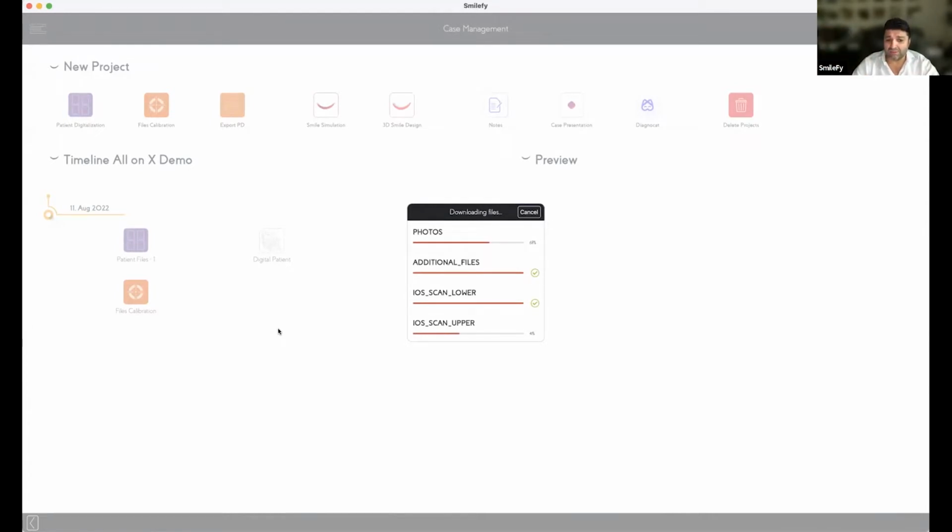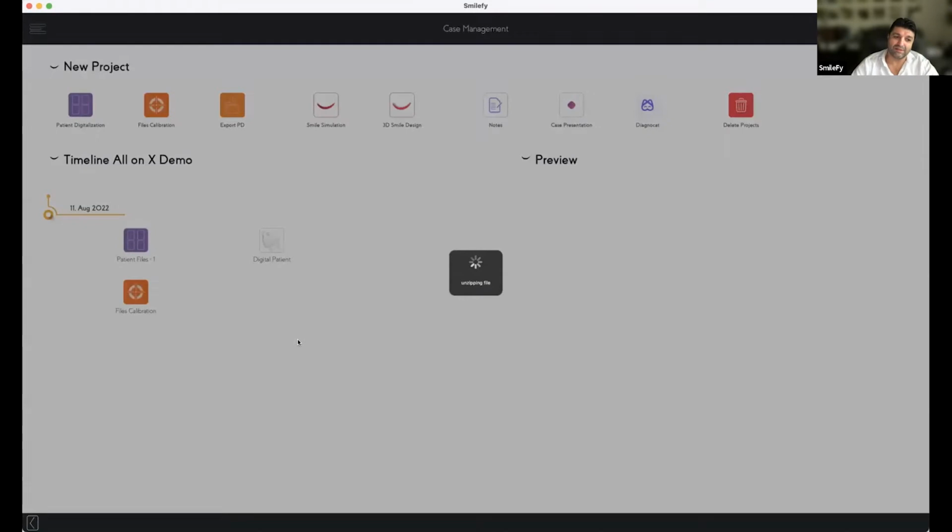And also the design was a little bit tricky because the midline of the intraoral scan is different than with the face. So that's a challenging case, but that's good because we can see all these situations and design, you know, considering all the real life challenges.